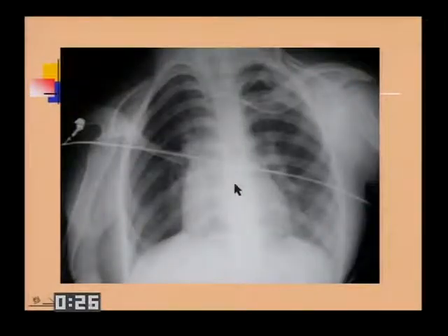When you see a differential density of the chest in adults, the first thing you think of is a mastectomy. When you think of it in children, you should think about something else along the chest wall. This is agenesis of the pectoralis muscle, and this child also has an abnormality, as you can see, of the upper limb. This is a manifestation of Poland's syndrome.